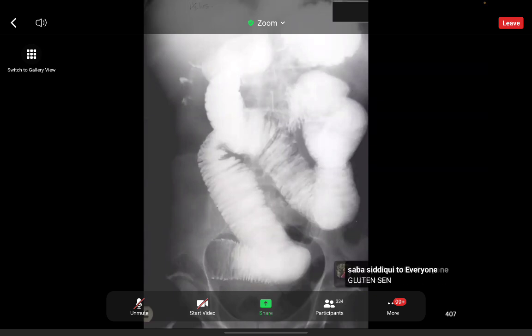It does look a bit like scleroderma, but can I just allow you to cast your eye over the liver? What can you see here? You can see branching structures which contain the barium. And although this does look like scleroderma, the stacked coins appearance, we've actually got a filling defect in the distal jejunum.